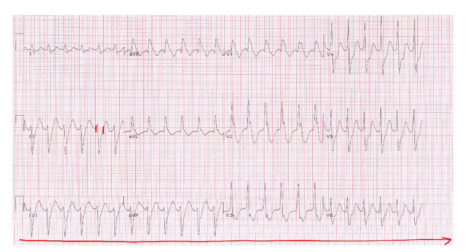Now, the one thing that I will point out is that there are P waves, but they are retrograde. So if you notice, here's a T wave going directly into our QRS complex, and then there is this little hump on the back of the QRS complex. You can really see it in lead V2. These are retrograde atrial depolarization deflections.